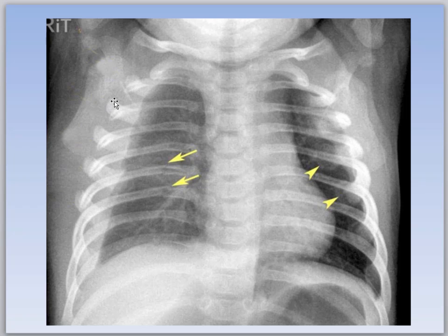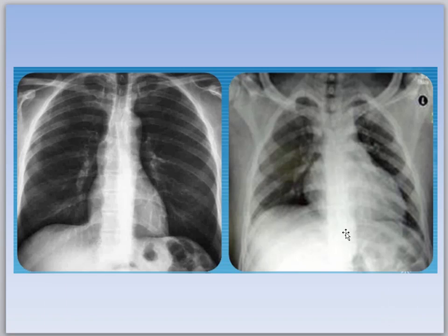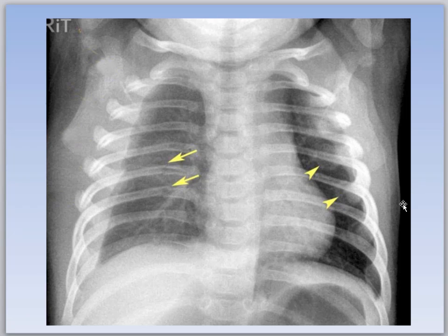Look at this, severe fractures. And they're not aligned either, so this poor child, this is just terrible. So they were just squeezed, and who knows what happened, but can you see how they're not meeting? Look on this side, you can see them, the normal. See how that angle that should come around the lateral part of the rib should be all intact. This one looks fine here, but this one is completely, it's actually subluxated, or luxated, or dislocated, you could even say. So, not good. Have to report that to the police if this is one of your patients, right?